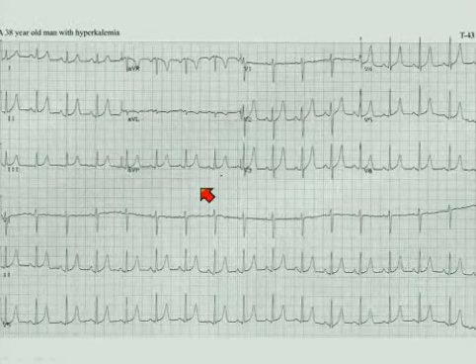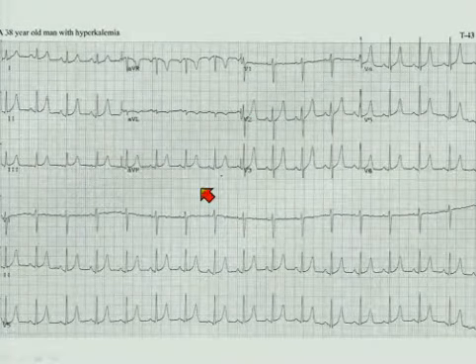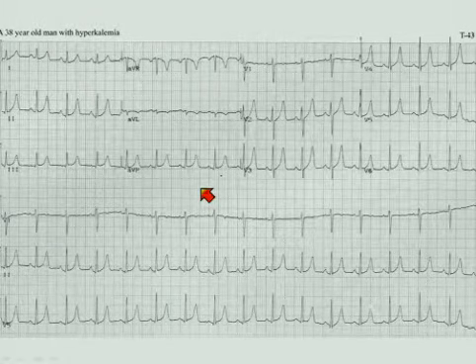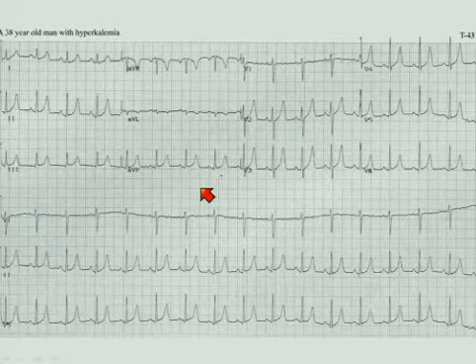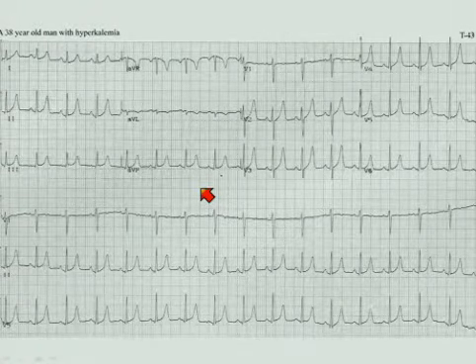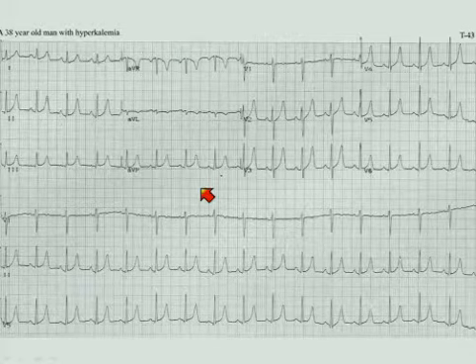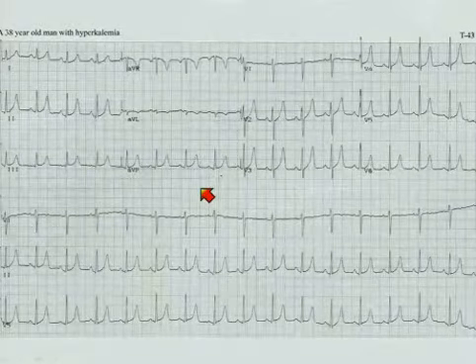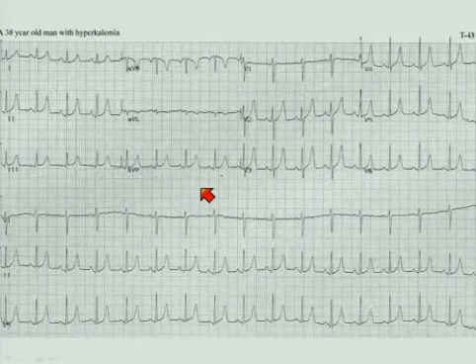Let's move on to electrolytes. The hyperkalemia that you will see on the board examination, if you do see one there, I would predict, will not be as dramatic as this one. And in other material I've given you for Saturday and the board's simulation that I've prepared, you'll have a more subtle one, which I think will be more similar to what might be on a test.